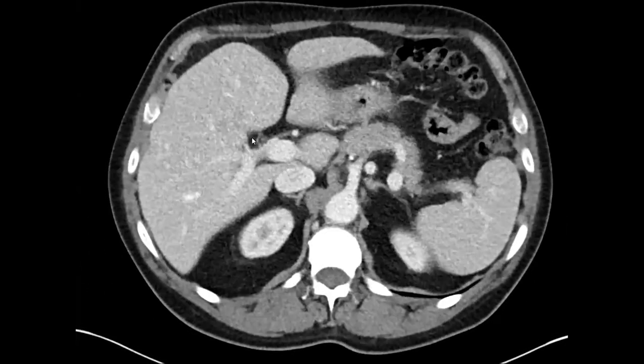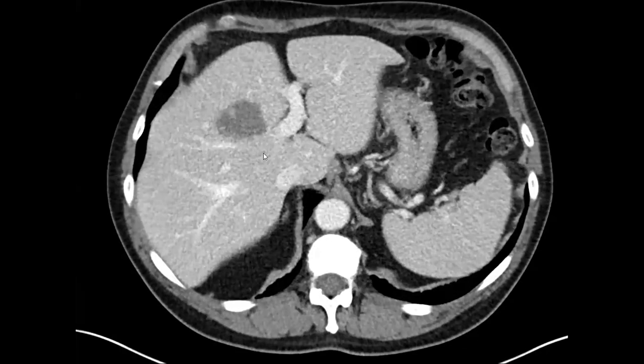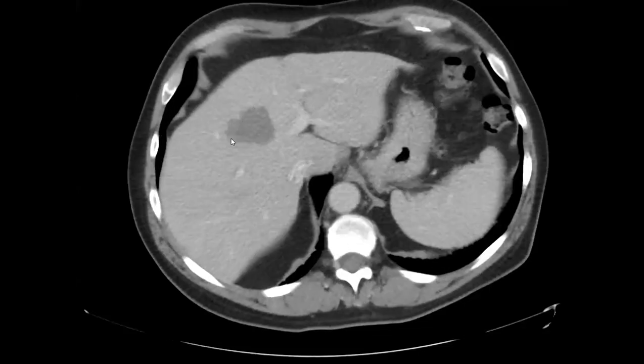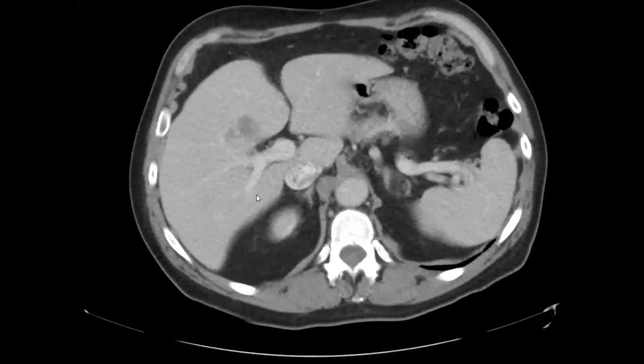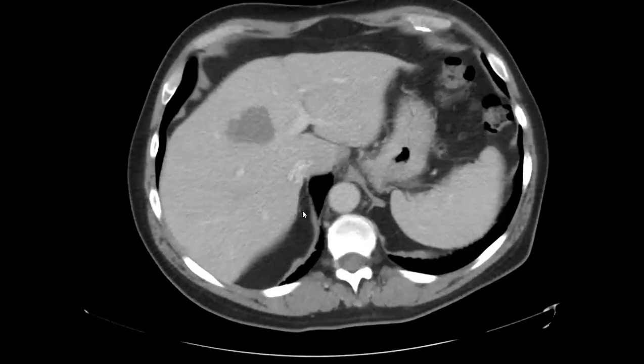One clue, so you guys couldn't be tricked: it looked kind of nodular peripherally, which makes you think more about a hemangioma. One point I wanted to make, because it was brought up that this is decreasing in size, therefore it must be a met. Hemangiomas can look different just based on the phase, because you're not seeing the edges well. It could be just filling in more on the other scan. So if you think it's a hemangioma and now it's getting smaller, it doesn't mean it's not a hemangioma. You could just not be viewing it in exactly the same phase. Does that make sense?